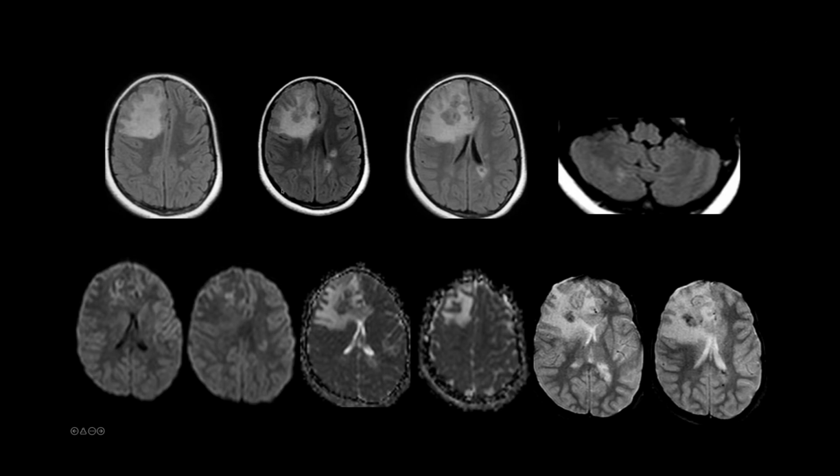So we have the MR images, non-contrast FLAIR axials on top, and you can appreciate these nodular lesions. The right frontal region demonstrates almost a conglomerate appearance with significant perilesional edema. There are also some tiny lesions in the left posterior periventricular region. Doubtful abnormality in the right cerebellar hemisphere, but it is hyperintense. On diffusion, there are central areas of restricted diffusion, especially in the right frontal lesion and also in the left posterior periventricular lesion. The GREs demonstrate areas of blooming in the right frontal region and also in the left periventricular region.